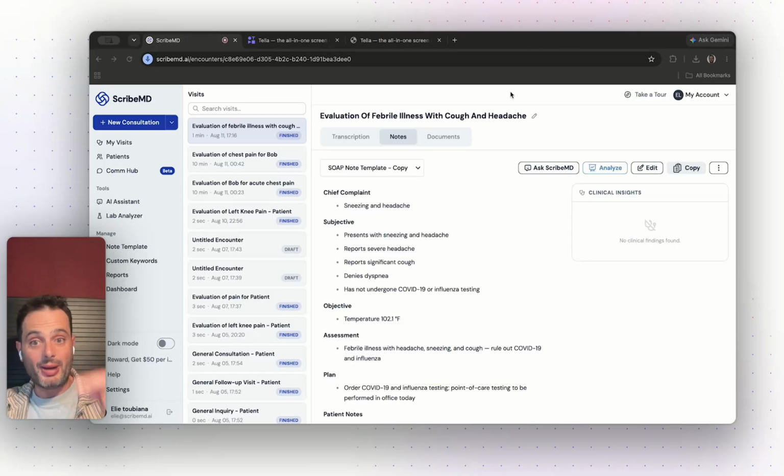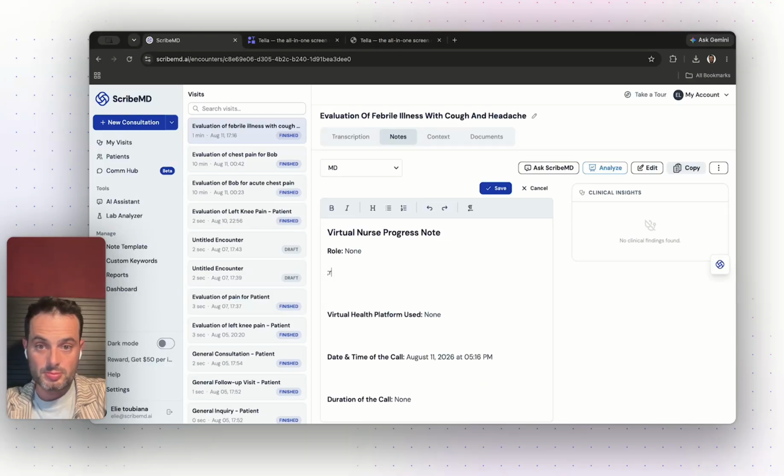The thing is, over time, as you give feedback, the AI will learn from your preferences and will try to add pronouns in that case, right?